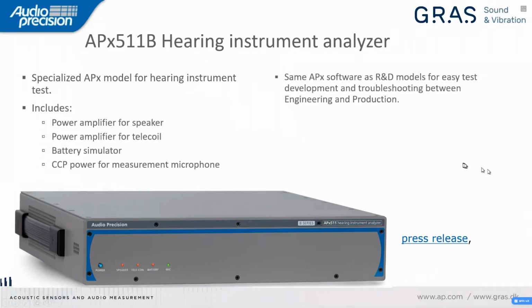This runs the same APX software as our analyzers for research and development, and so with this we can have easy test development between engineering and production. It has fast measurements and it has high performance, as well as very flexible software.